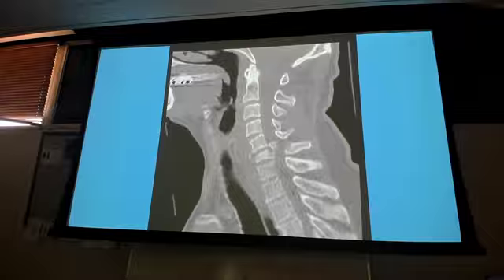Yes. So are we visualizing like a chunk in the middle there? I was getting there, yeah, right there. So that is sitting in the spinal canal. So now we also have spinal stenosis because I have a fleck of bone from this fracture sitting in there. Can you count one? Absolutely. Here's my spinous process, right? So 1, 2, 3, 4, 5, 6. Bam. So the compression is on the front half and then the stenosis is the back portion. Correct. Two separate things going on here, right? Because spinal stenosis is anything that's narrowing that spinal canal area. Also have the compression fracture on the vertebrae.